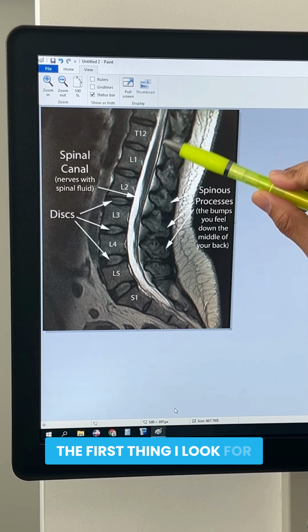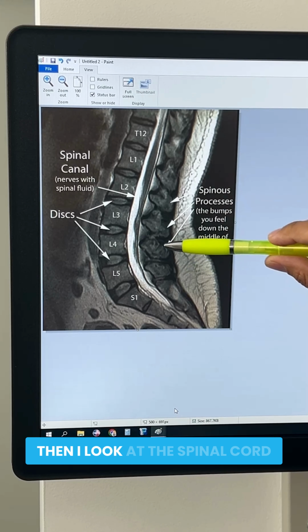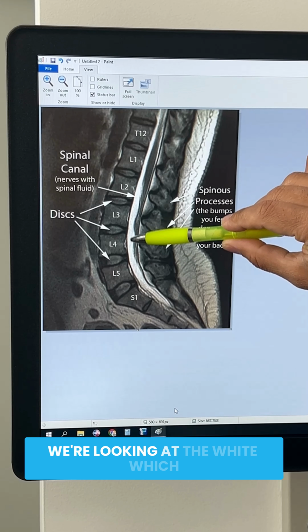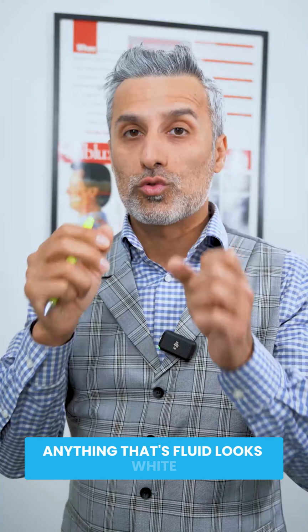The first thing I look for is the curvature of the spine, which is good. Then I look at the spinal cord, which is inside the spinal canal. We're looking at the white, which is spinal fluid on MRI. Anything that's fluid looks white.